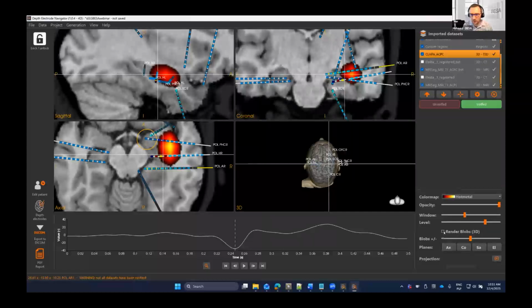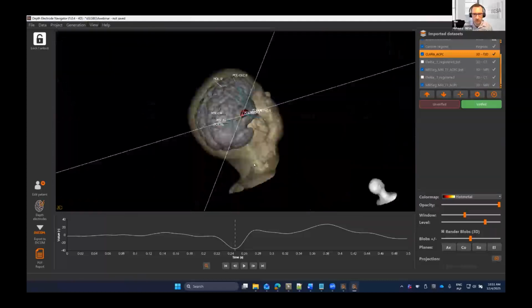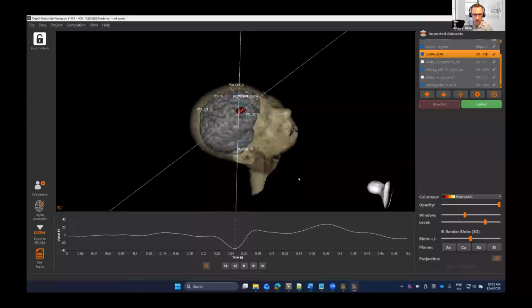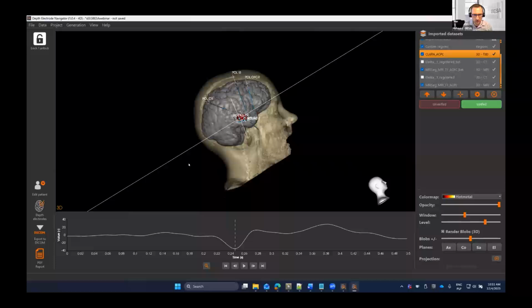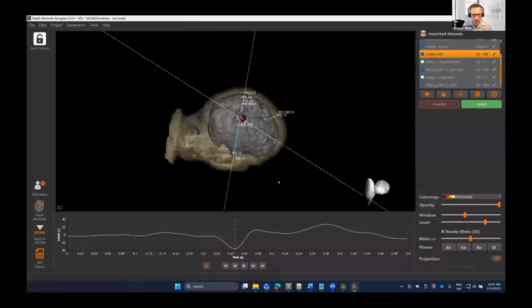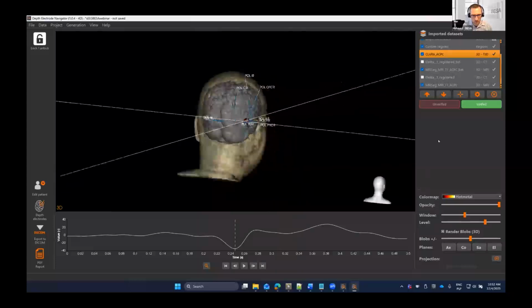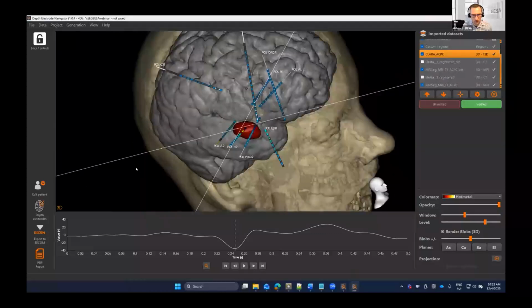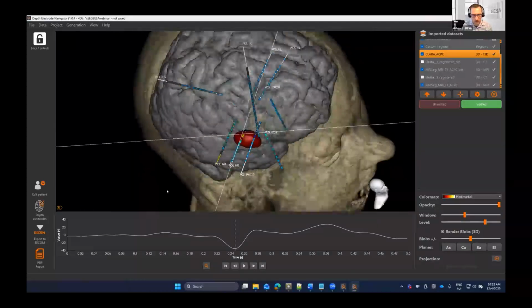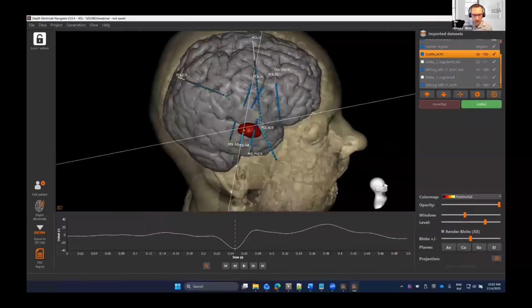So Clara, you can render the results. And this is a very nice result, I would say, to show how it looks like. Let me just organize the view for you. So now we can see how it works nicely. And yeah, that is kind of a thing.